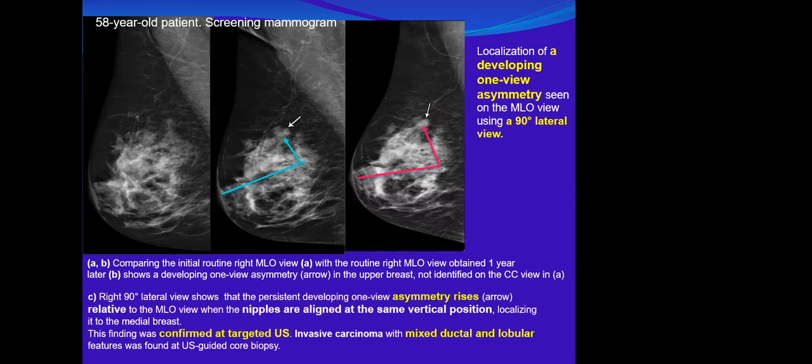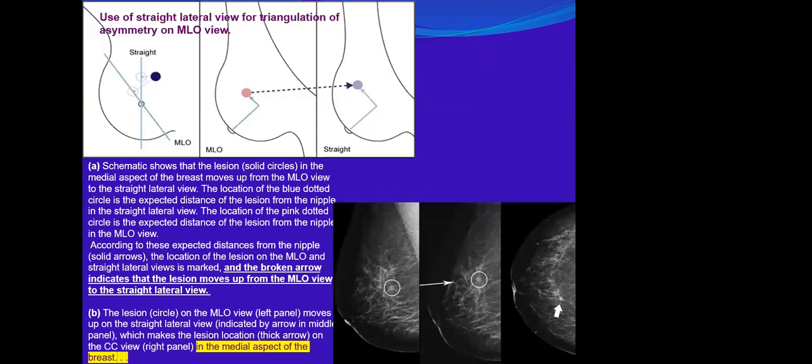See? This was confirmed by targeted ultrasound to be in the medial breast, and it was mixed ductal and lobular carcinoma, invasive ductal carcinoma.